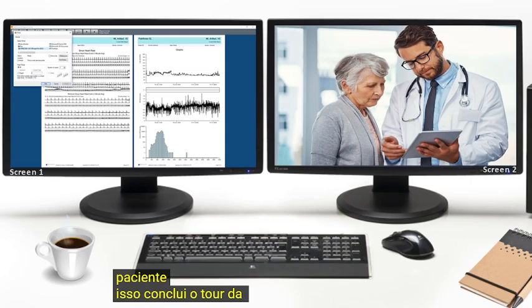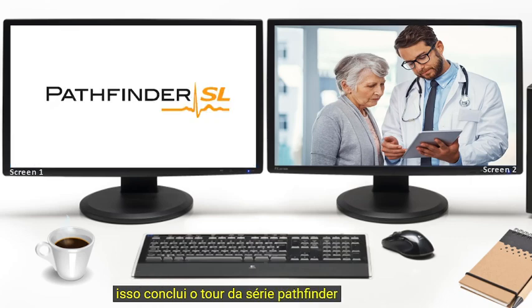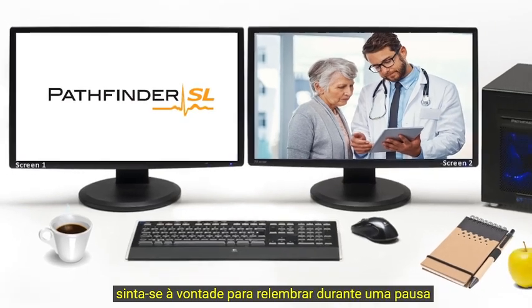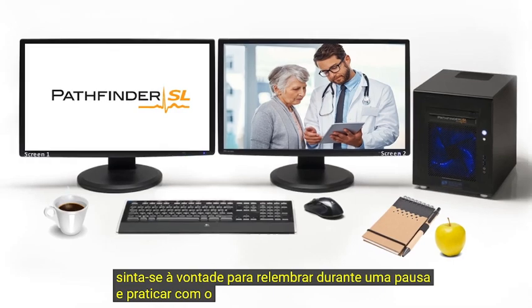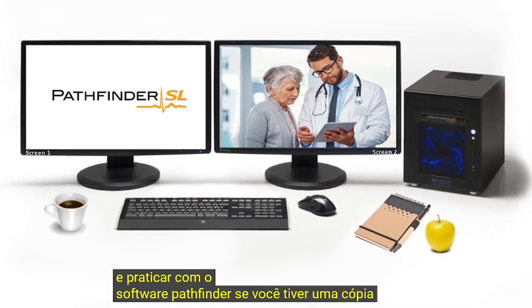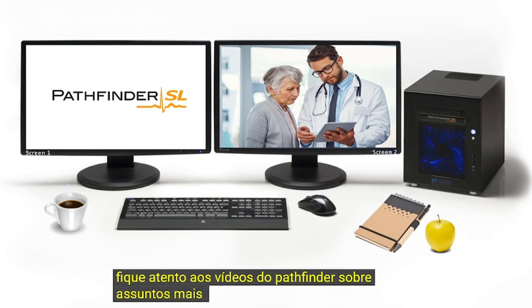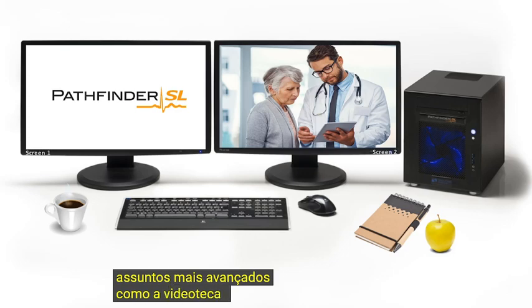This concludes the tour of Pathfinder series. Feel free to look back through, pause, and practice with the Pathfinder software if you have a copy. Keep an eye out for Pathfinder videos on more advanced subjects as the video library increases. Bye for now.